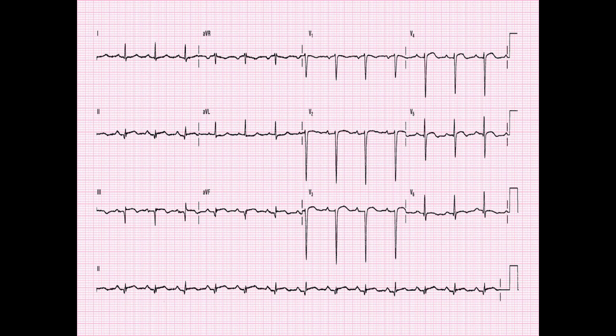and then drops a QRS complex and starts all over again. When identifying AV blocks, we are focusing on the P wave, we're focusing on that PR segment itself and the PR interval in total. So the beginning of the P wave to the beginning of the QRS complex is what we are focused on here. So take a moment and look at this 12 lead. And when we're talking AV blocks, so what do you see? We're going to look at that PR interval.